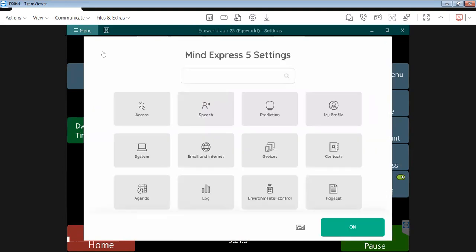Now let's talk a little bit about message banking. There are a couple avenues through which message banking can be done. Some people may do message banking ahead of time with their speech therapist and have a list of audio files that can be downloaded directly onto their Eyegaze Edge tablet. Other people get their Eyegaze Edge tablet and then they want to message bank directly onto the tablet.